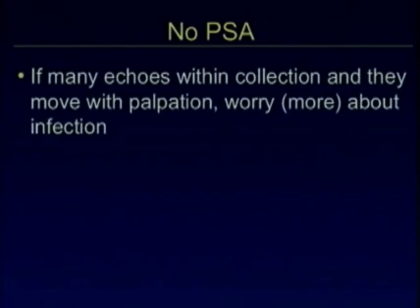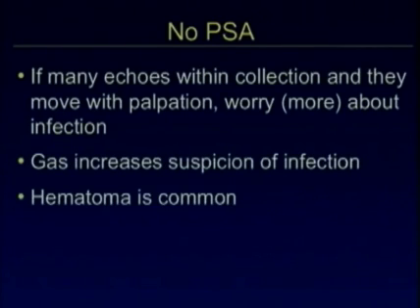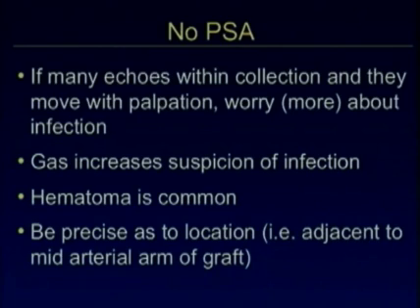Now, if you don't have a pseudoaneurysm and you have lots of echoes like that other case that I showed you, you need to worry more about infection, but you really can never know for sure whether something is infected or not unless there are gross air bubbles within. But again, a hematoma is very common. These patients are on hemodialysis 3 times a week for 4 hours at a time, so they've got lots of hematomas. When you're describing this, be precise as to the location. Say where exactly it is, because if they go to surgery in a day or two, that hematoma may have decreased in size. So you need to be precise.